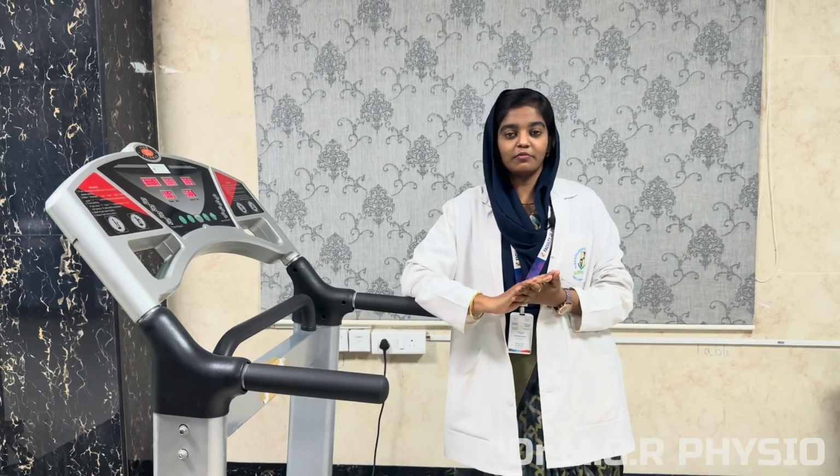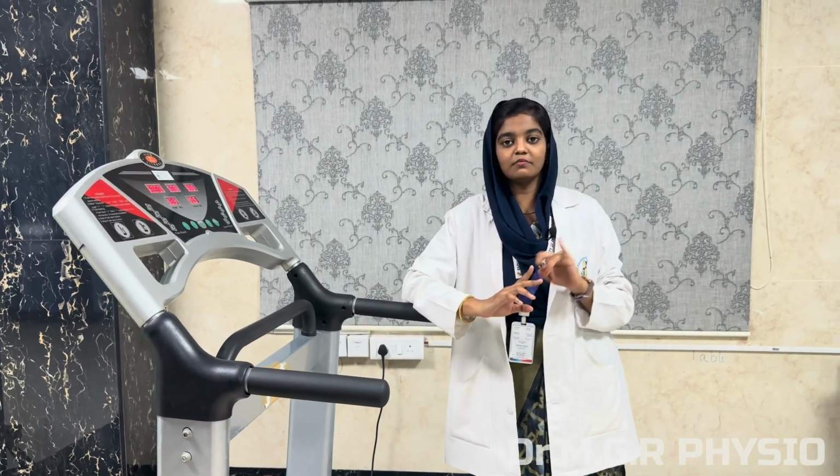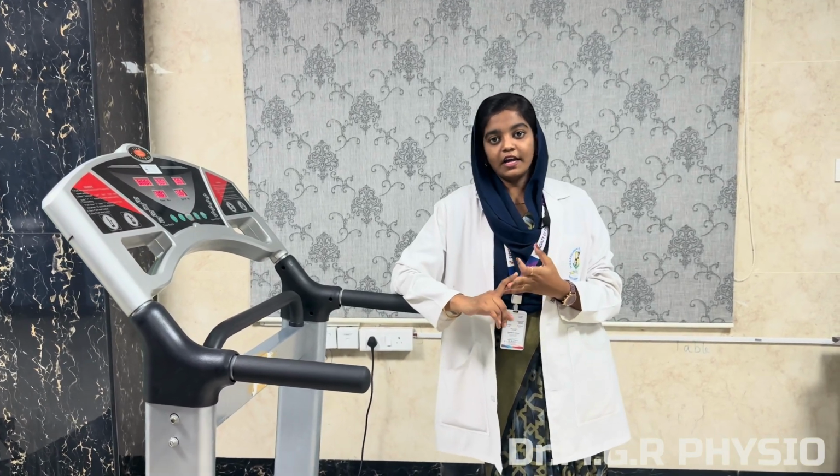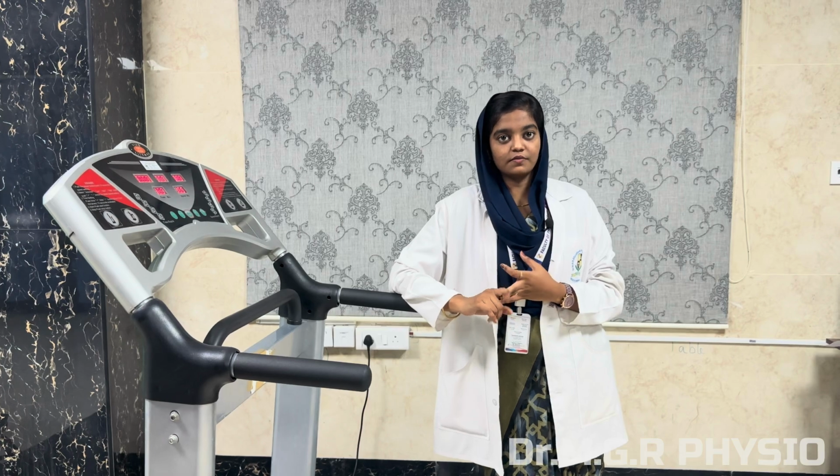Now let's discuss the benefits. It increases muscular endurance and cardiovascular endurance, and improves the growth of muscles and joint and bone tissues. This will help prevent the recurrence of fractures that can occur in osteoporotic persons. Now let's discuss the contraindications. Pregnant women should not use whole body vibrators, and those who have severe migraine or implanted cardiac pacemakers should not use these machines.